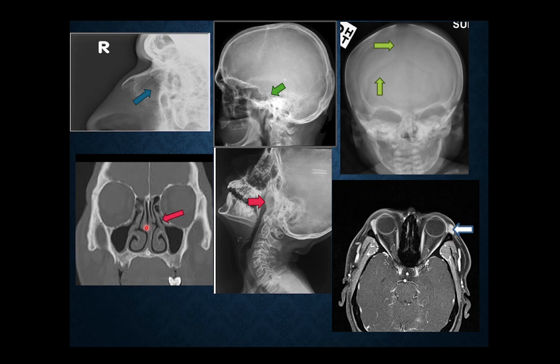Okay. This arrow is pointing towards which structure? These are the muscle belly, optic nerve, eyeball, and superior lateral is what? Here. Lacrimal gland. So is the lacrimal gland intraconal or extraconal? Extraconal. Thank you. Thank you, Dr.